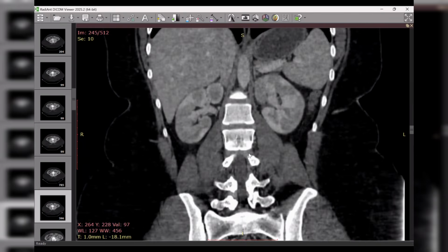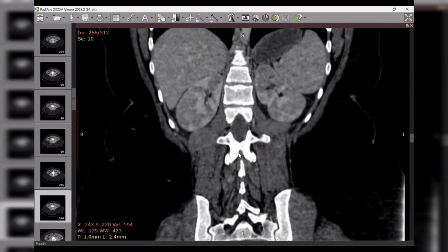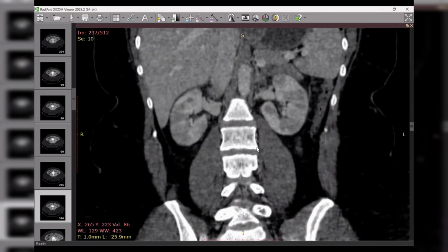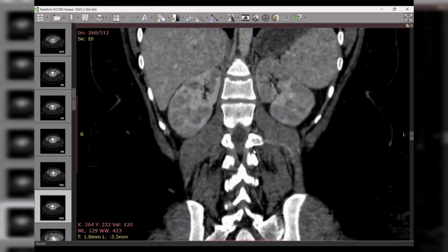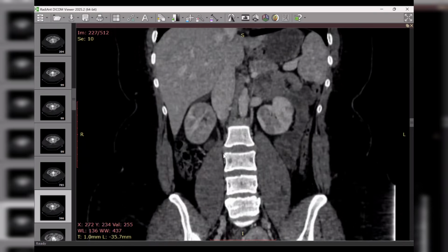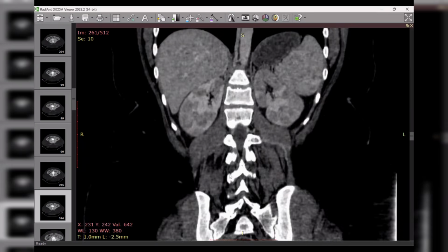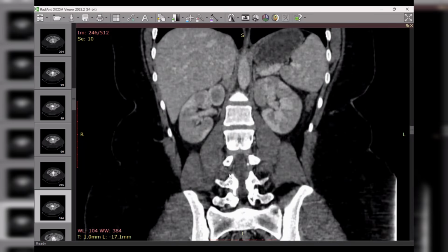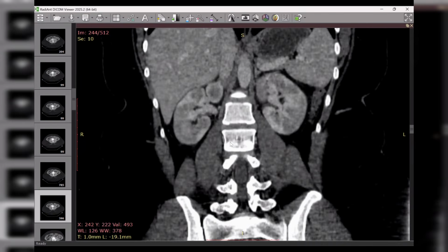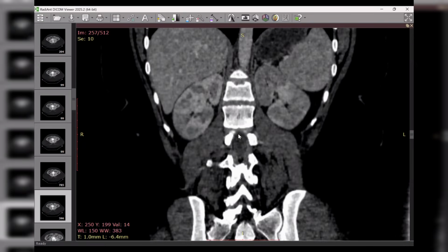So you are searching for the underlying cause, right? Yes, right. Let me give you the clear clinical data for this one. This is a known case of sickle cell disease on treatment. Okay, so this could be sickle cell vasculopathy, which is causing small vessel disease. Exactly. When I met this case, I was really surprised. What is this? Then I scrolled down, as you said.